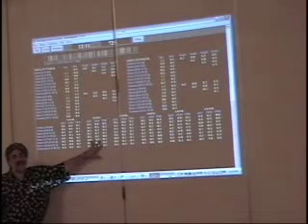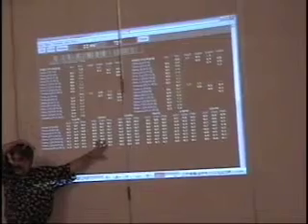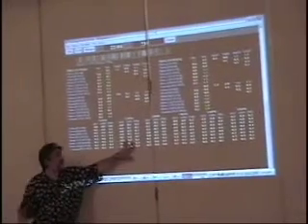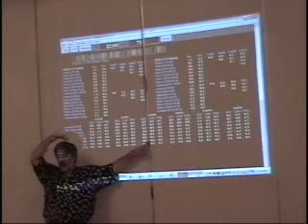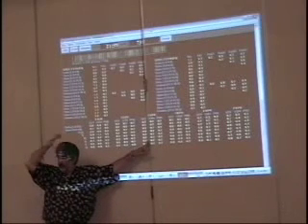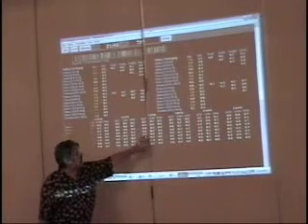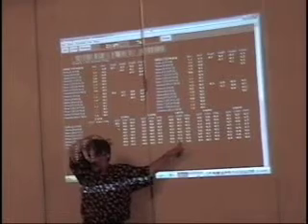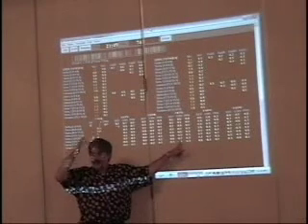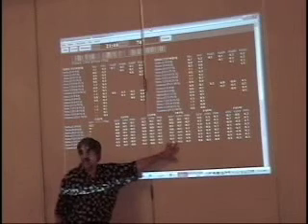This section is F3 to P3. So this is left hemispheric intrahemispheric connectivity. This is F3 to P4, which is one of the first diagonals. Left frontal to right posterior or parietal connectivity. This one here is F4 to P3. So we have right frontal to left parietal posterior connectivity.